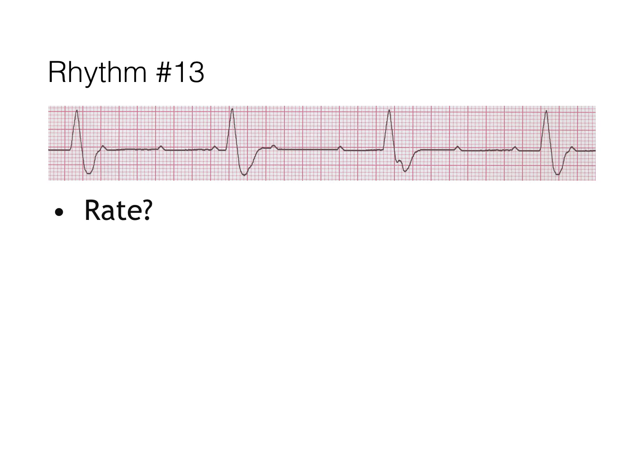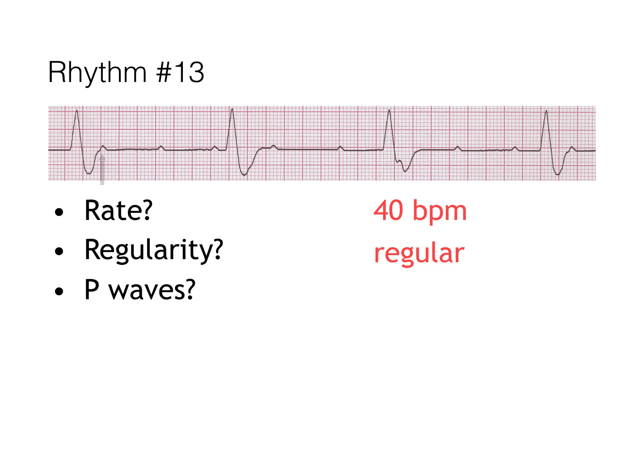Now in this rhythm, the rate is 40 beats per minute. Is it regular? Yes, it is regular. What about P waves?